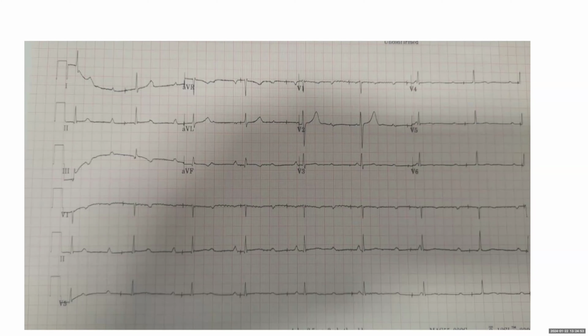So you guys mentioned complete heart block. That is correct. So I hope you can see that the P waves and QRSs are dissociated. You see how here it's just coming closer and closer, so this is not conducted. The QRSs are regular. Yeah. So this is complete heart block.